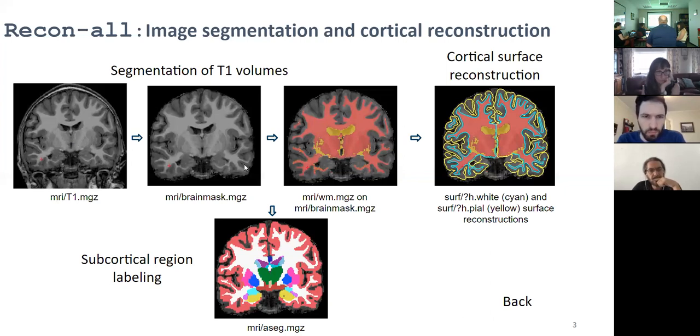But certainly by the time you get to the brain mask image, it makes a first guess at where the white matter is. Then it tries to make the white matter more uniformly white and the gray matter more uniformly gray, so they can increase the contrast between the gray and the white. And there's another image called brain.mgz, where it does that even more so, such that you lose some of the detail of the subcortical structures, ganglia and thalamus.